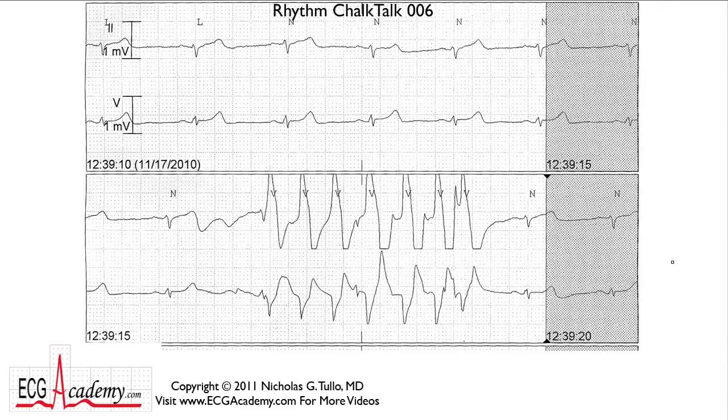Now, I want to get right into this one because it's a great tracing. It's a common problem that most people don't think about. And I want to introduce it to you here on our 6th Rhythm Chalk Talk. So let's get right to it.